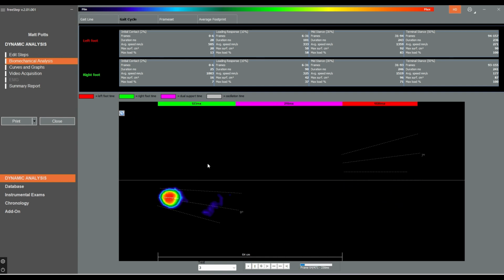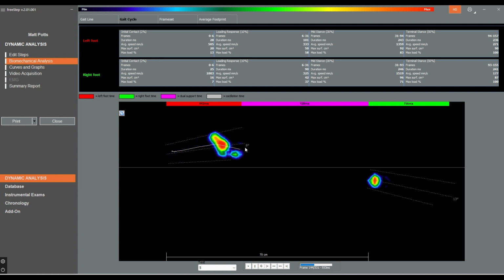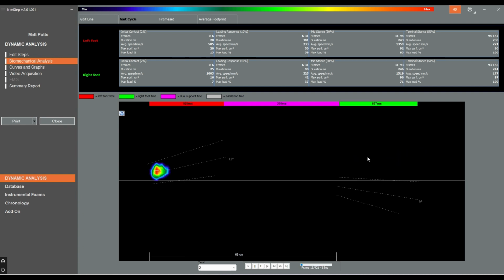And the interesting thing is a straight line. What does this one do? Straight line, yes, straight line. That's quite an oblique movement. Obviously in nature, in the human body, you would expect these movements to be quite smooth rather than sharp. So it's like I really want to take all that pressure, and we know from the image that happens in the midfoot. So I'm trying to avoid using my left hallux. It's a bit smoother here as we transfer off the right, but you get the gist.